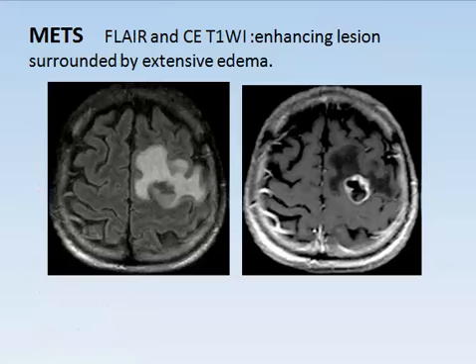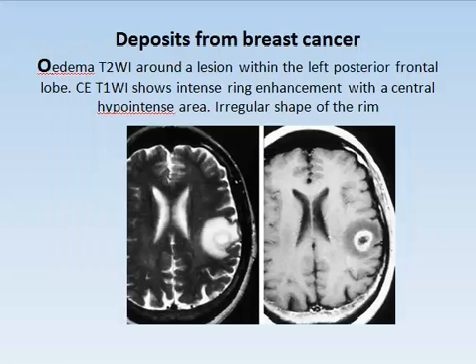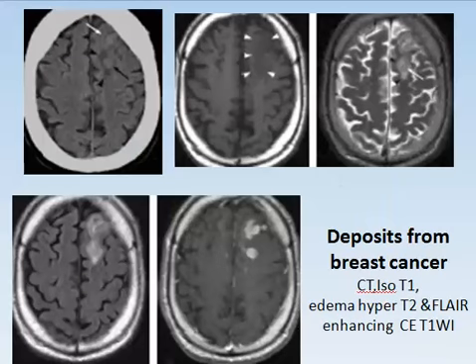So here it is intra-axial, here it is intra-axial with ring enhancement but an irregular rim, and here again it is still intra-axial, showing nothing on CT, and nothing or minimal hypointensity on T1 weighted images, iso or minimally hypointense, but it may show the edema and the lesion in the middle on T2 weighted images.